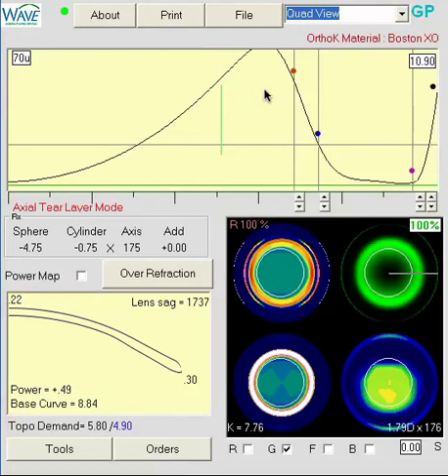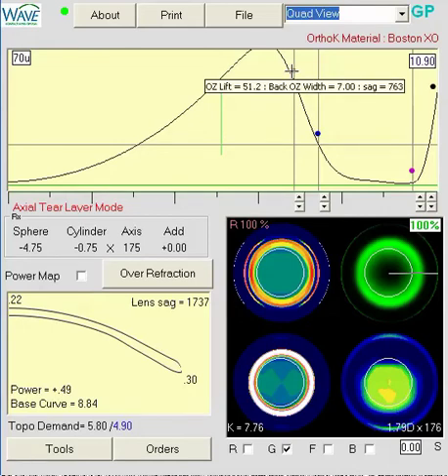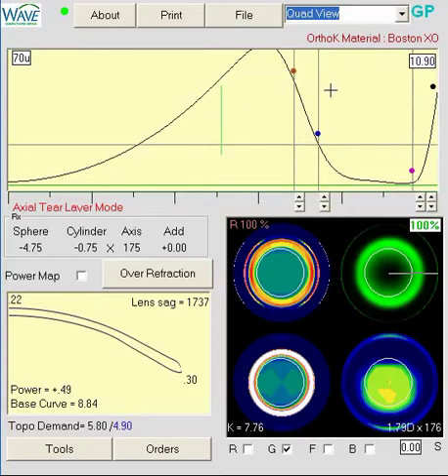And for the purpose of myopia control, I would reduce the OZ and the IC all the way down. I usually do a 5.6 and a 6.2. With an adult, that sometimes introduces some glare, and so I might do a 6.2 and 6.8. But I think where it is right now, we've got pretty big OZ, which will lend itself towards giving us a larger treatment zone, but in a smaller lens, in a 10.9 lens, it doesn't give us very much room in the periphery to align the lens.